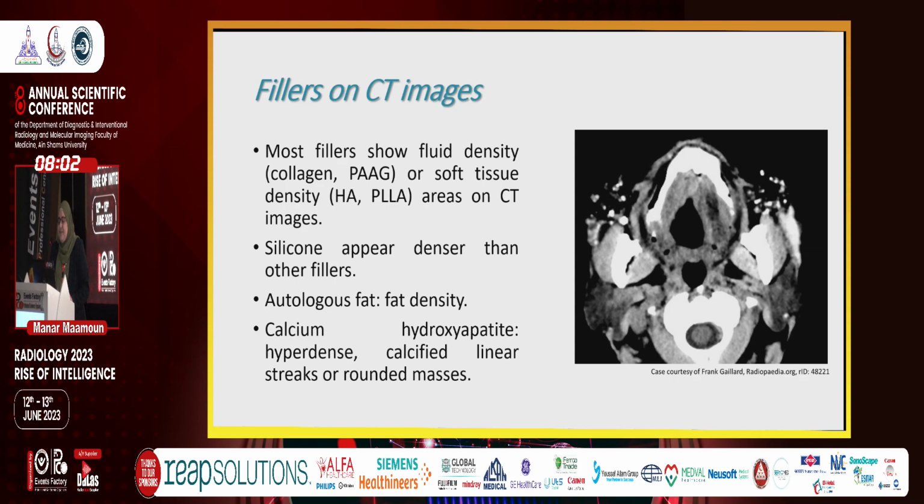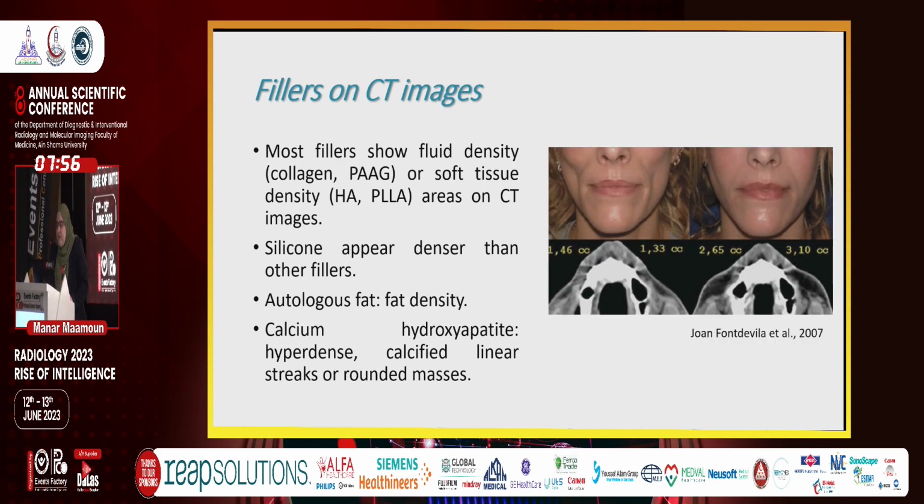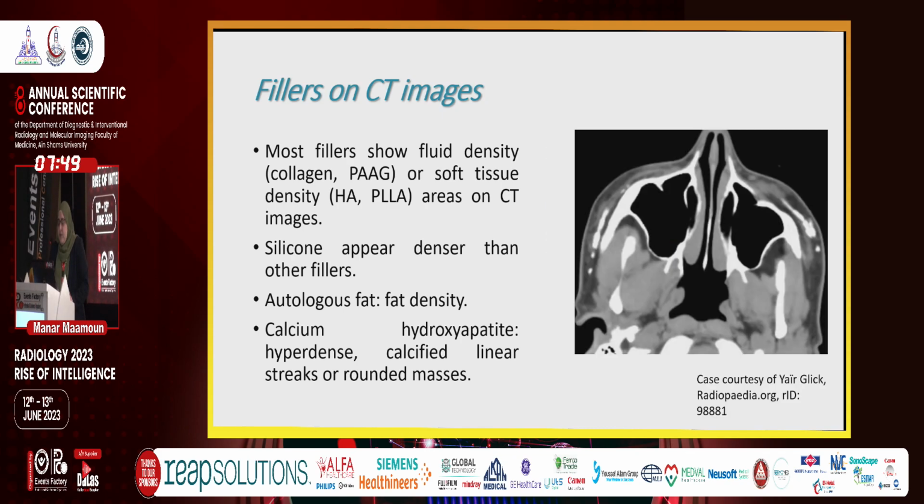Silicone appears denser than any other used filler, approaching the density of bone. Autologous fat can also be used. It shows fat density on CT and MRI. Calcium hydroxyapatite appears hyperdense, calcified, usually injected in a streak manner, so it should be differentiated from silicone.